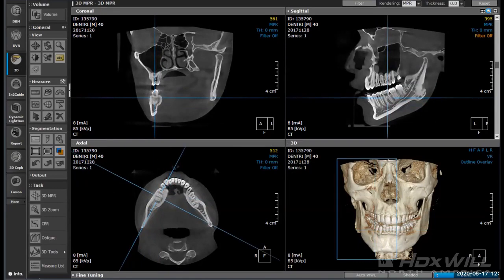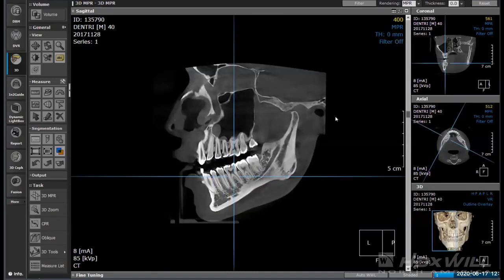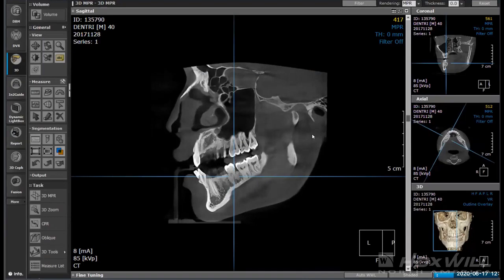So under this circumstance, we're going to be looking at doing number 30. So we're going to look through and scan around the bones. We can see the nerve canal here fairly clearly, and we can see the teeth around it. We can actually look around and see what we have available to us. Interestingly enough, you can see that root right there curving right around where the nerve is, but we can walk through it and examine the bone from that perspective.